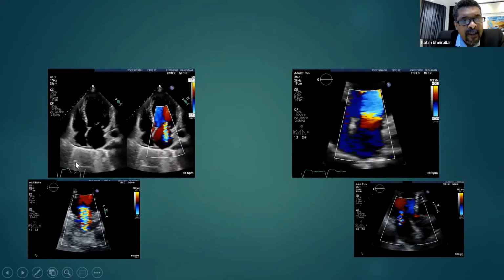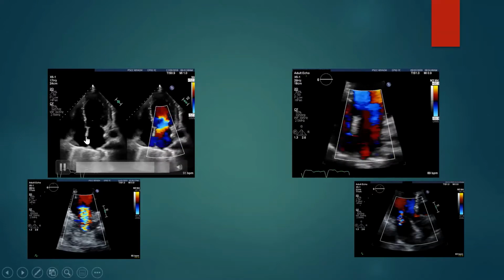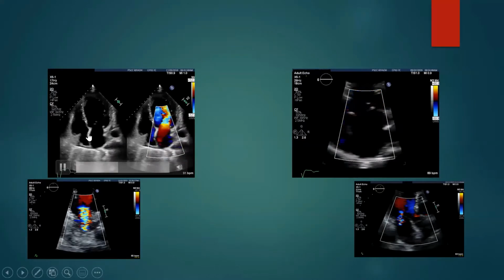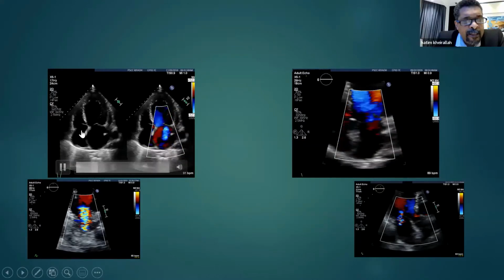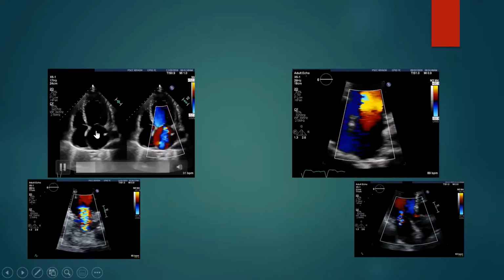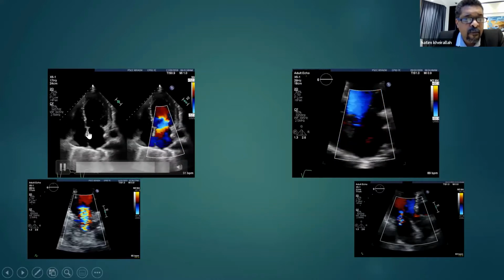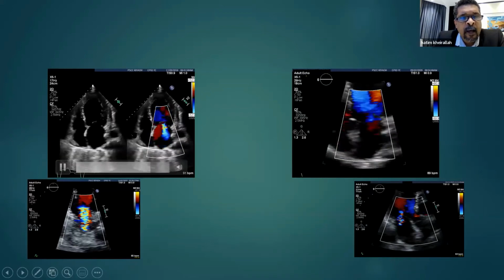Did you observe that the septum here, the interatrial septum, is also abnormal? Aneurysmal, yes. And that indicates pressure overload, possibly bowing to the right side. Yes, and this is due to volume overload. So it's like because of the pressure or volume overload here, because of the mitral regurgitation, possibly.